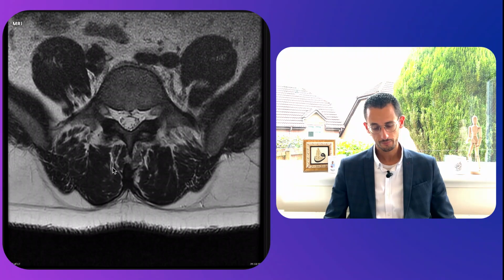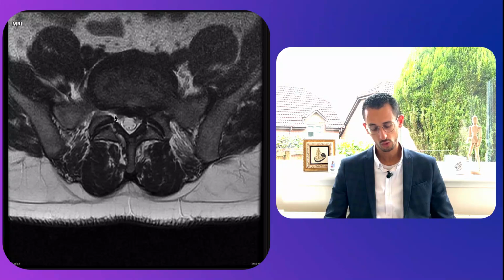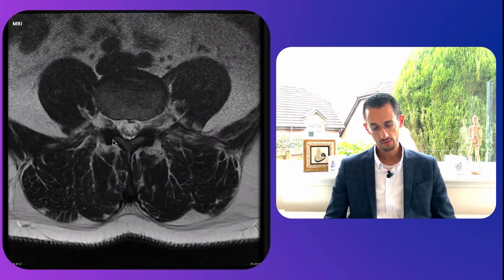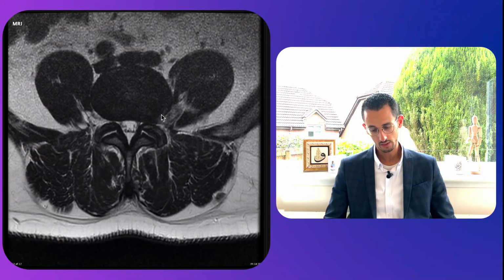And if we look at the axial imaging here, again, within the center, that looks all right. That's probably the L5-S1, which is, again, a bit of disc prolapse, might be causing a bit of lateral recess stenosis. But if we go higher up to the level above, what we can see here is that there's probably something causing pressure on the L4 nerve root, which is that kind of grayish color here. So that's basically a lateral disc, or disc coming in the foramen, which is causing pressure on the L4 nerve root.